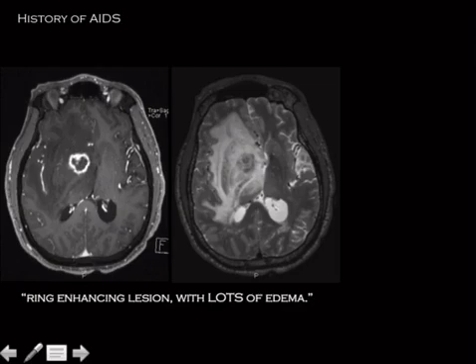What else restricts diffusion? Abscess restricts diffusion. Classically, bacterial abscess. That's going to be an important thing to remember. Certain infections will restrict diffusion. Some stuff that I'll show later on. Stroke obviously restricts diffusion.